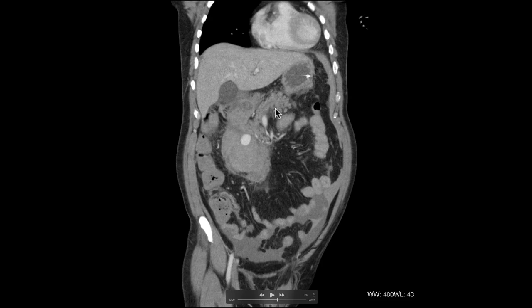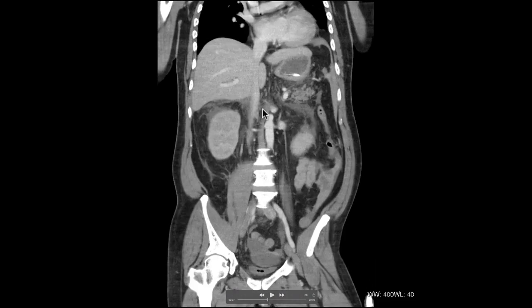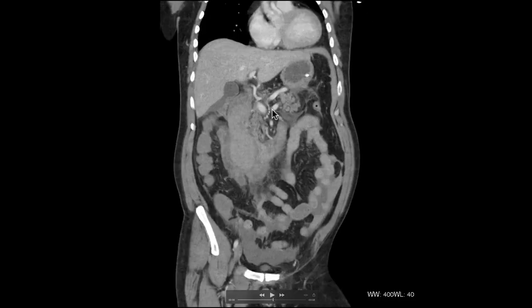If you had a patient with chronic pancreatitis, you'd be looking for those sort of changes too. That would be things like pancreatic parenchymal calcifications, or a dilated ectatic duct and ectatic side ducts. And sometimes you get very atrophic pancreases if you've had a lot of pancreatitis.